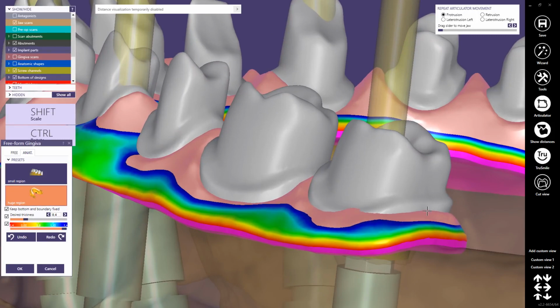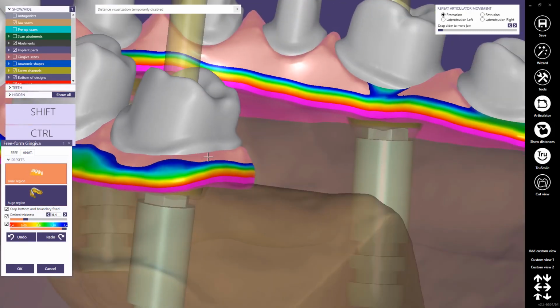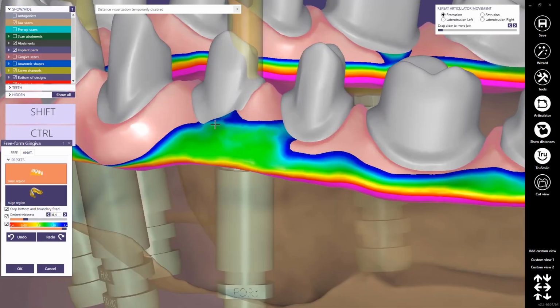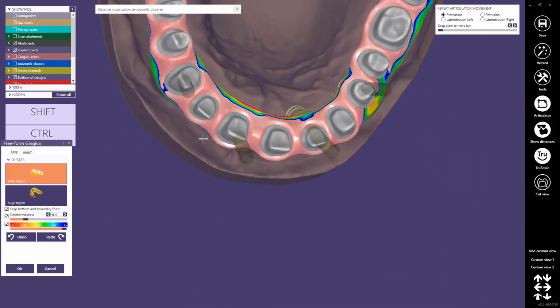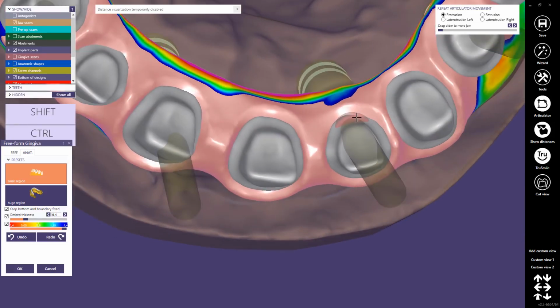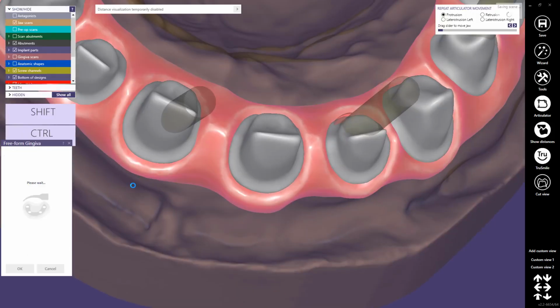Do some adjustment here. Yeah, here we might have some troubles later, but we can arrange this in the freeform of the thimble.